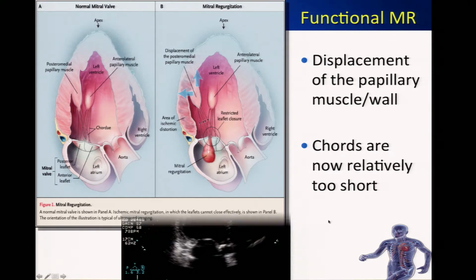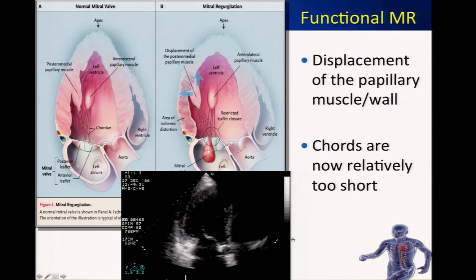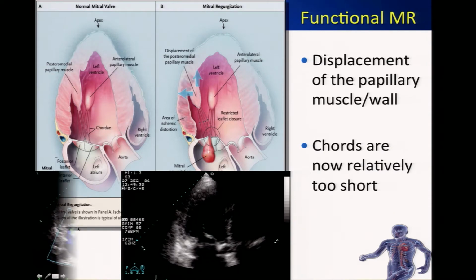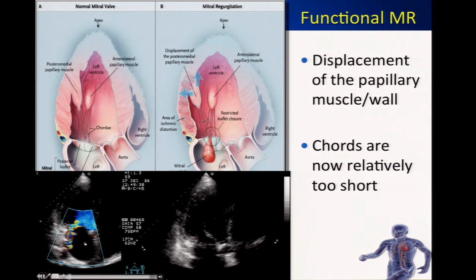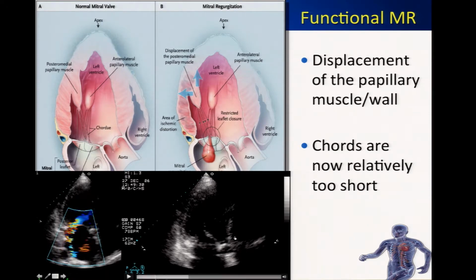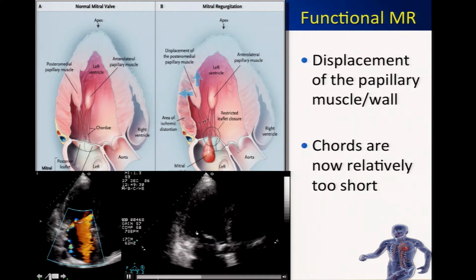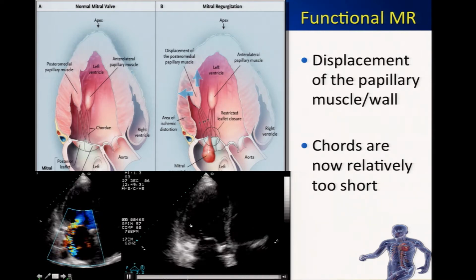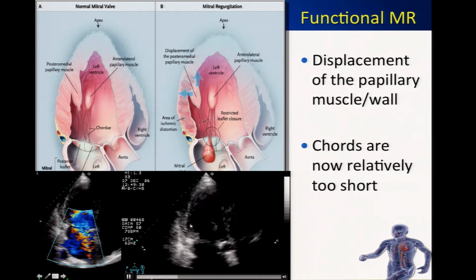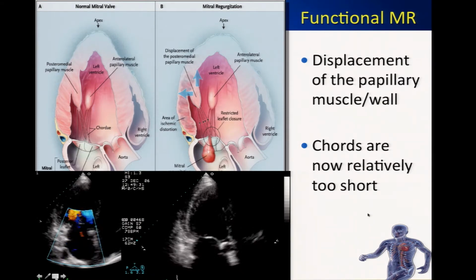It's not a rare bird. This is an example I like to show because this was a case where actually the segmental wall motion had been missed. And then you turn the color on in this case and you see there's MR. And this, by simply asking the question, as I've harped on, why is there MR, you look at it again and you say, well, there's this little hooking here of the anterior leaflet, and oh yeah, there's a little bit of hypokinesis here on the inferolateral wall. So sometimes the MR actually reminds us to look for wall motion. So mechanism.